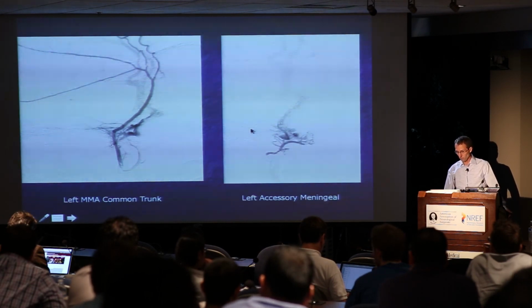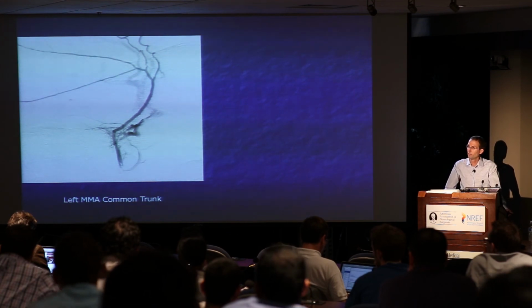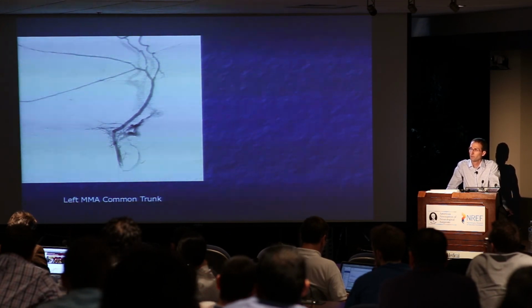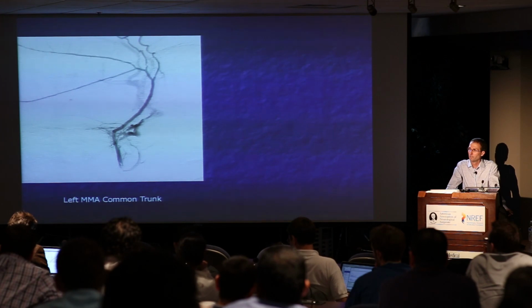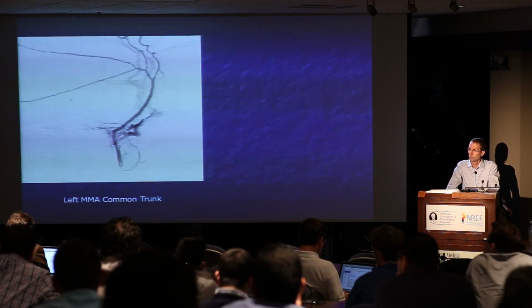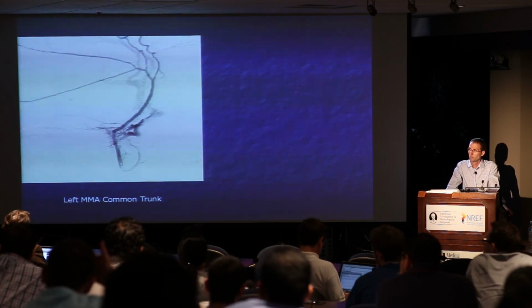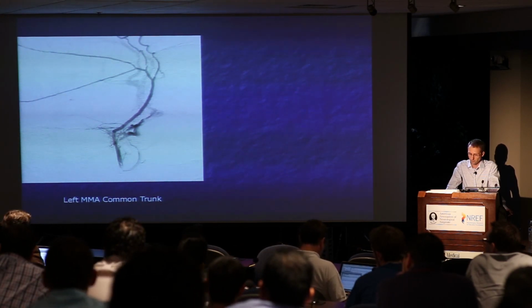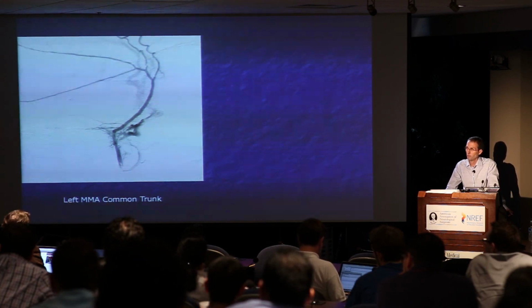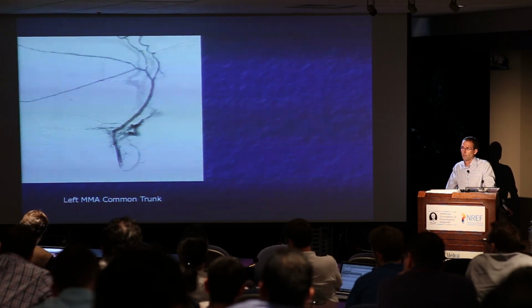We've hijacked your talk a little bit. But that's okay. So there's an expression, measure twice, cut once, right, in carpentry. Well, we're not working on a 2x4. Yeah. And when I have seen myself fail or seen referrals of other failed treatments of AV fistulas, it is people neglecting to fully analyze all of the views and just starting to spray Onyx, often, or whatever, into the arterial side of a fistula.